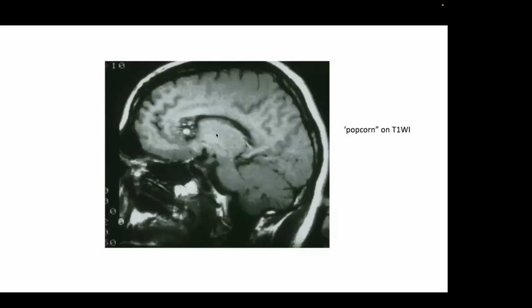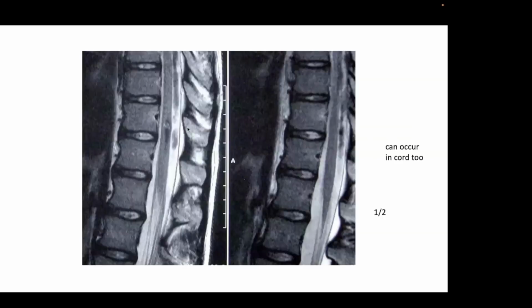Here's another cavernoma here adjacent to the ventricle. These can be purely intraventricular and may lead to superficial siderosis. So you can see that together as well. This is sometimes described as a popcorn appearance, these multiple small areas of T1 shortening. And so these are probably pockets of subacute blood that give this appearance. But again, all cavernomas should have a dark hemosiderin rim visible on T2 weighted imaging.